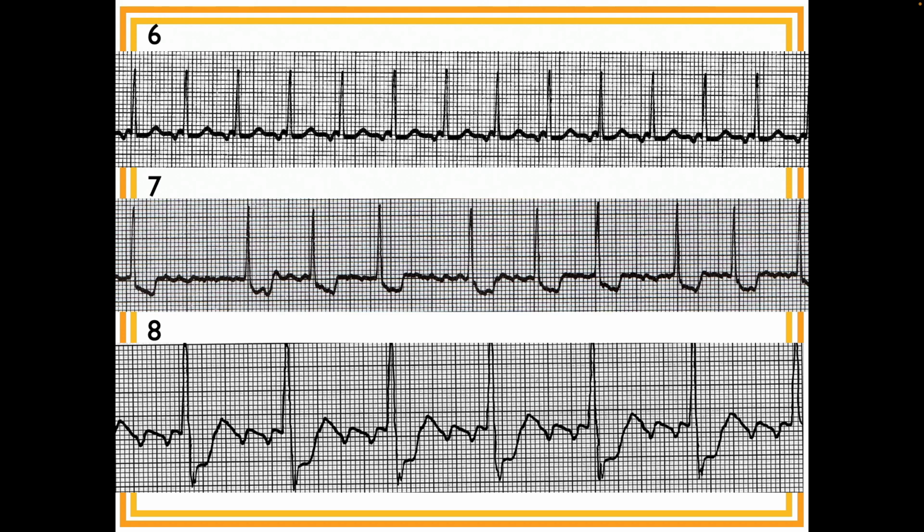So what are you calling the underlying R to R, if you will? This one is pretty close, but that one is not close. That one, pretty close, but that one, not close. Now that one is a little bit short.